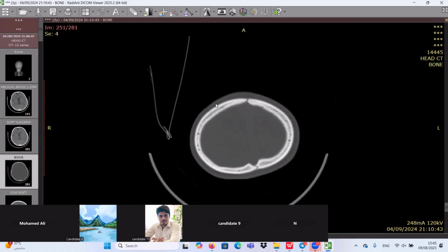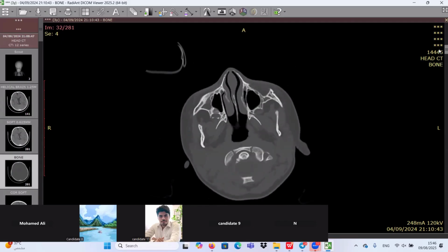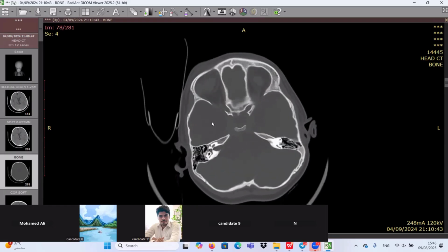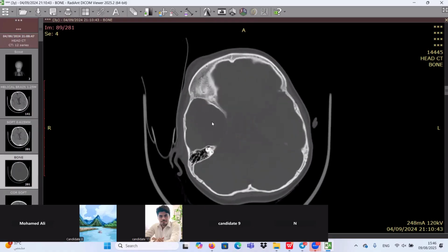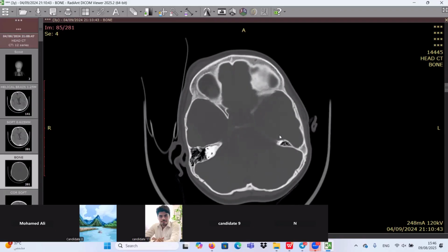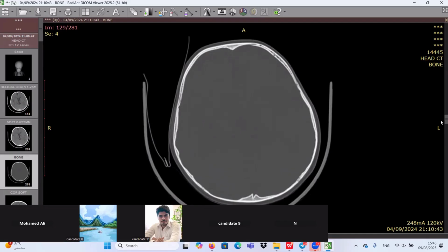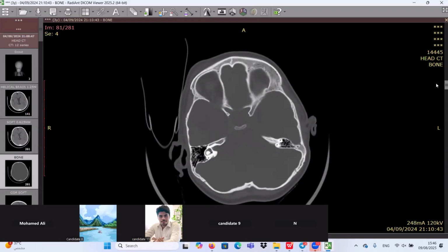I want to look at the skull base to look for any fractures there. Also, the coronal plane is very important to check the orbital floor, to check any blowout fractures. We don't have significant bone remodeling for the arachnoid cysts, and the petrous bone is normal. All of these structures are normal. So these are important negative findings in any case of trauma. And as you said, we have bilateral extraaxial cystic lesions, most likely arachnoid cysts.